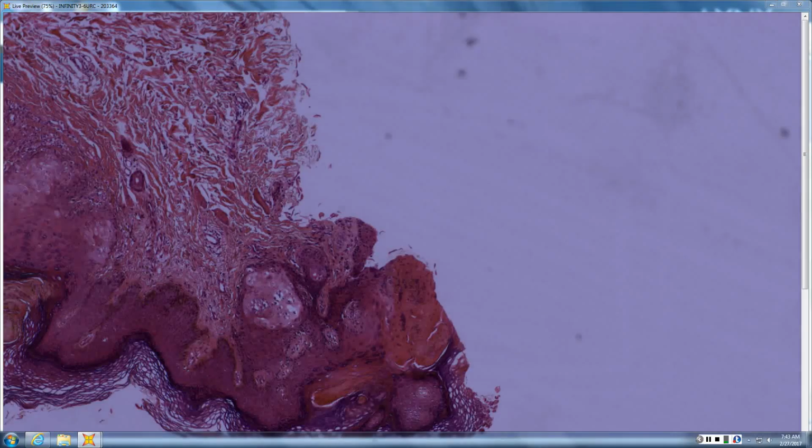Do you know any setting in which a patient would have multiple verrucous lesions that would show herpetic change in the follicles? HIV or immunosuppression. Exactly. So you just diagnosed the HIV infection in this patient with verrucous zoster.